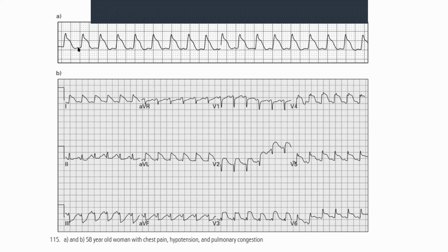If we had to take a PR interval, if you say it is a P wave, then we've got 2 to 2.5 to 3.5, so we've got a normal PR interval. Do we have a QRS complex after every P? If we consider this as the P, then yes, we do have a QRS after every P. Are they narrow or are they wide? They're quite wide, which tells us that we should be looking at it almost as though it's coming from a ventricular origin.